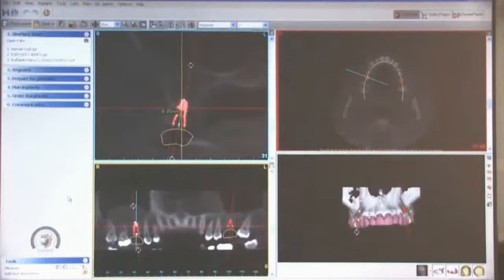You're an old friend and a very experienced implantologist, so I don't need to obviously tell you anything about how to place implants, but what I wanted to do is just go through with you the views we have with the SimPlant software. Yes. And we had tentatively dropped in the implants where you had requested them, and then what we can do is go ahead and change those per your recommendation, since you're ultimately going to be the one placing the implants.